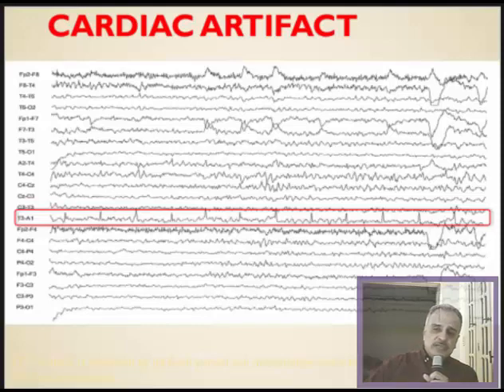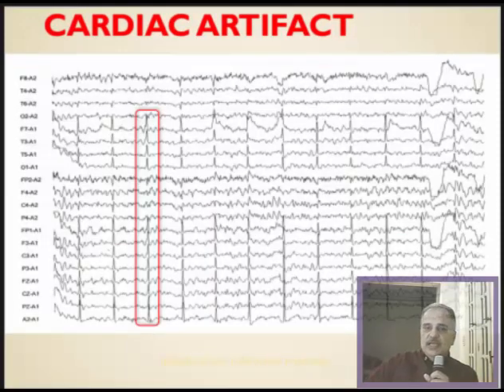In this bipolar montage, with exceptional A1 referencing in one channel, we can notice biphasic regular waves like sharp waves with equidistant intervals. If we have an EKG channel, these sharp waves will coincide with those of the EKG exactly. In this monopolar montage with ear referencing, similar sharp waves with the same intervals in between. They are found bilaterally but asymmetrically.